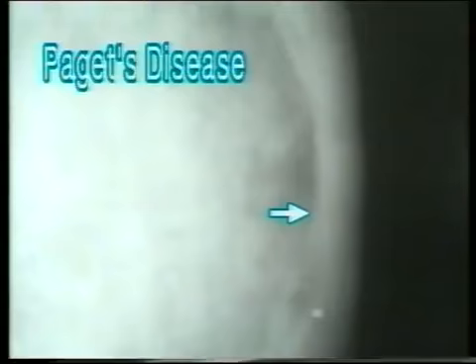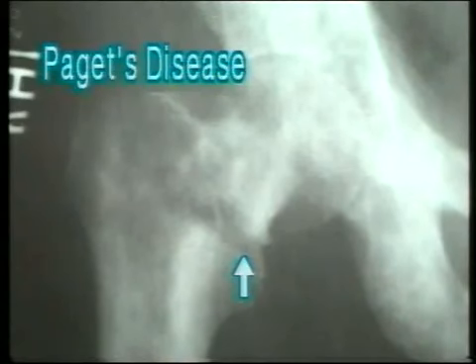However, in spite of thickening of the bone cortex, the bone does not gain in strength. On the contrary, it becomes fragile and brittle. This patient has come with a fracture of the neck of the femur. Note the thickened cortex which is fractured.